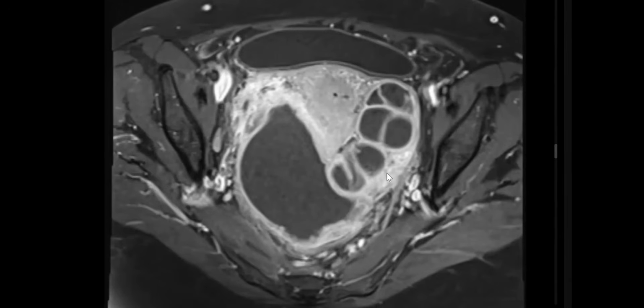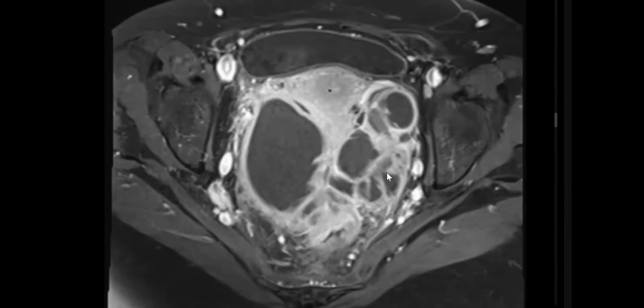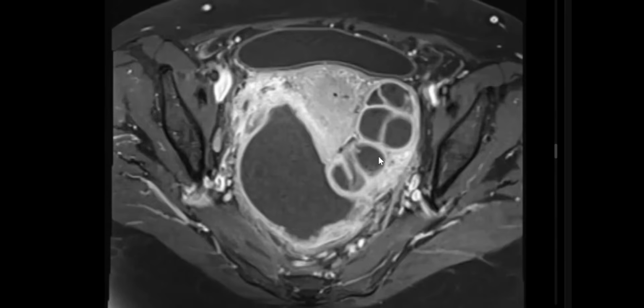In such a case, no normal ovary will be seen on usual sequences like T2. And again, it's a gynecological surgical emergency for drainage and antibiotic coverage. Repeated history is usual because it's a common case of PID; post-operative is unlikely to present like this. Thank you, my friend.